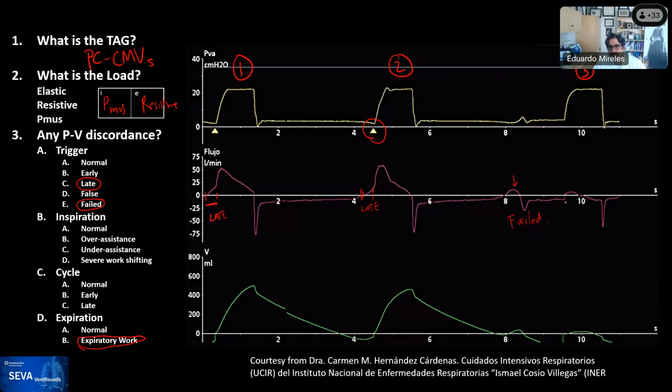But a manifestation of that, and we have presented several cases in which we have patients that have this prolonged expiration, and then the machine delivers usually a pressure control breath, and it doesn't deliver anything. That's a marker that the patient has activation of the expiratory muscles. So this doesn't take away that you should be touching their belly and examining the patient as you're going through the exam. All righty.